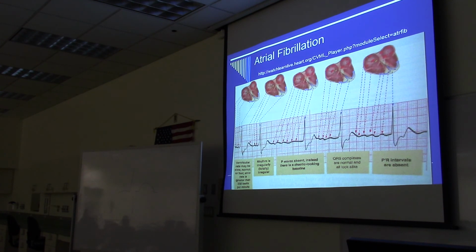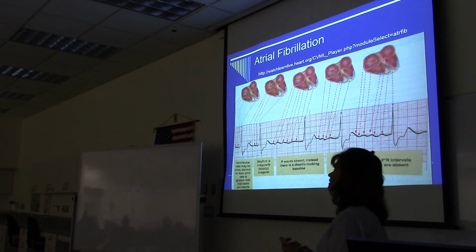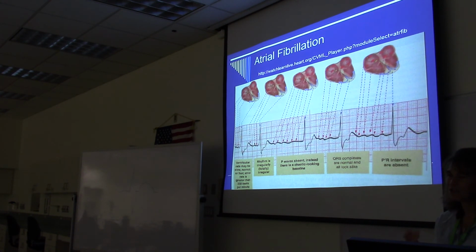You're going to see a wavy baseline and no nice P waves. So it's an irregular rhythm, and you don't see P waves.